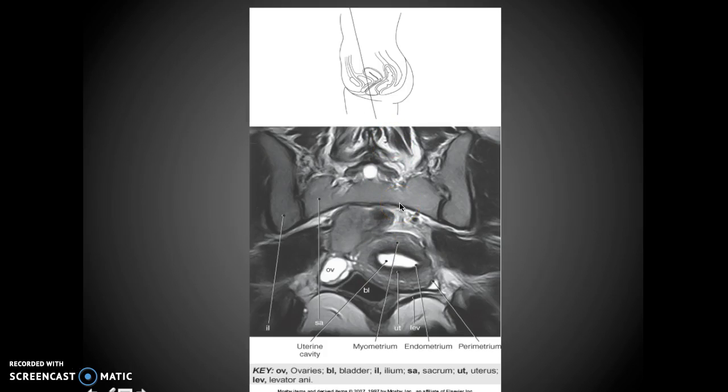This is a really steep angle that we do on MRI, trying to get an axial slice here. It actually flipped it upside down, so as you can see, the sacrum is up here, and this happens when we angle too steep. It actually flips the image upside down, so hate that, but it's fine. It doesn't change the reading. So here is your sacrum and your ilium.